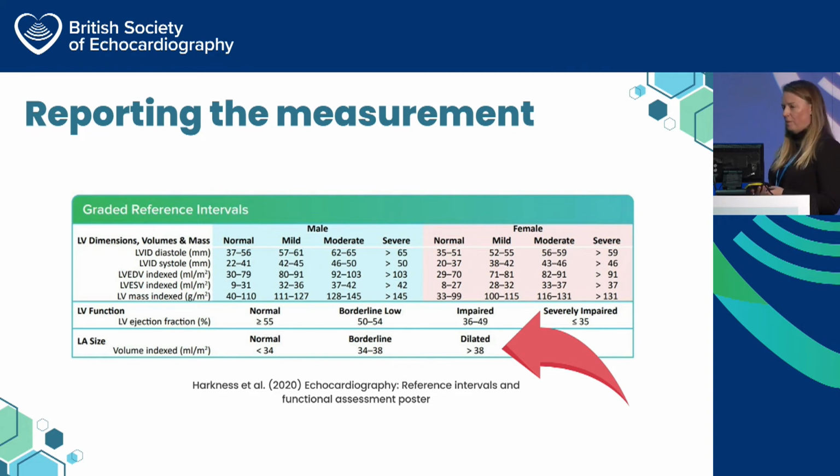Back to our left atrium. We're indexing our volume. The decision making is quite straightforward. Is it normal? Is it dilated, or is it somewhere in between? And I would firmly recommend that you use this terminology in your reports: normal, dilated, or borderline.